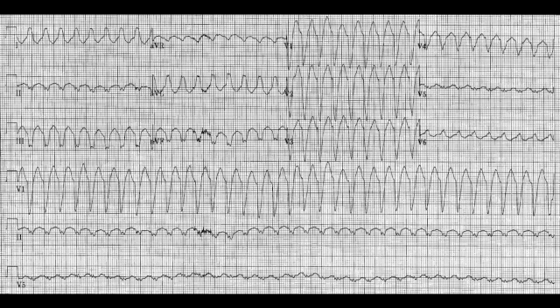So this is the EKG you get from him. Go ahead and pause, take a look at it, and think about what you think is going on here. There's some people that'll say it's probably not VTAC because he's got such great vital signs and he's completely awake with humor. And there's other people that say, well, the left bundle branch block pattern and the blah, blah, blah. Let's not worry about that.